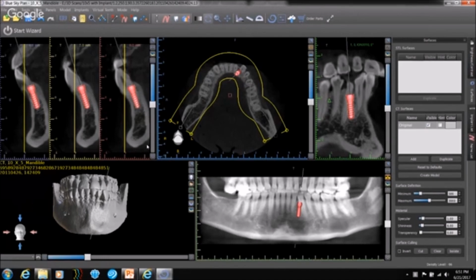In fact, the D1, D2, D3, D4 bone classification was based on a different criteria. In this imaging, you don't need to know those numbers, but you're able to see much more detailed structures like trabecular pattern, osteoporosis, lack of trabeculation, osteopenia, and thinning of the cortical bones. So it is a little bit more detailed. One common mistake that I generally see is trying to apply those older classifications.